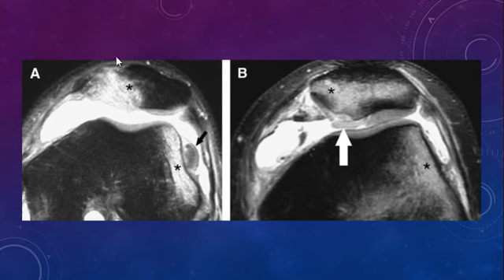You can see here, imagine if this patella was dislocated here laterally, this articular surface is impacted against this articular surface, resulting in bone marrow edema at the medial aspect of the patella and the lateral femoral condyle, and the medial retinaculum and the medial ligaments will be torn or injured, associated with some joint effusion, of course. You can see here also an osteochondral fracture. There is some loss of the articular cartilage over this part.